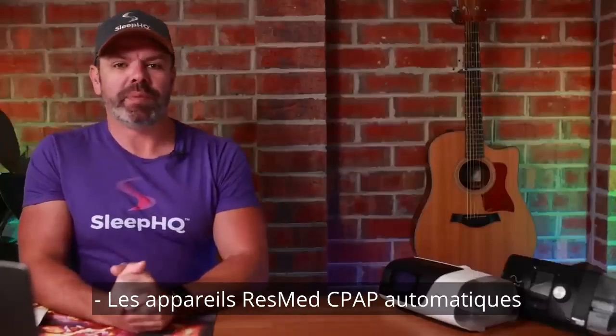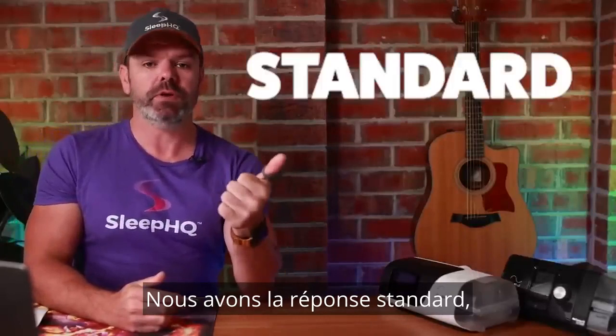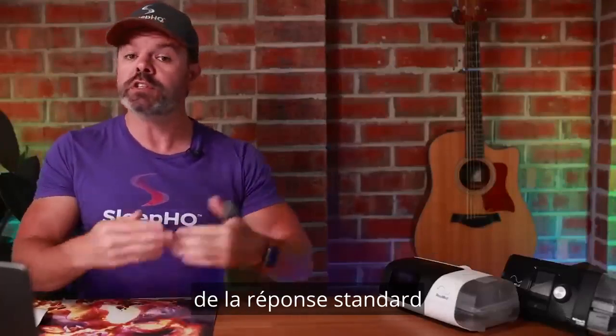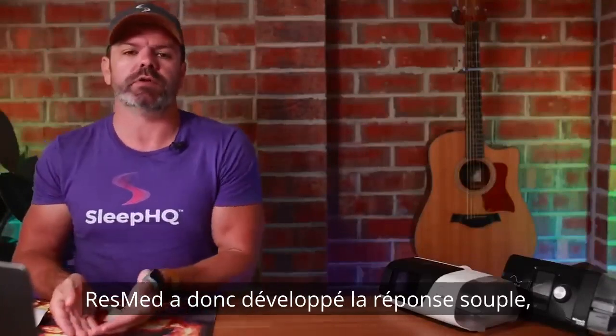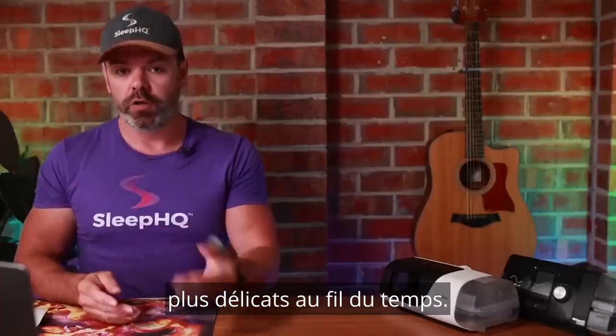ResMed automatic CPAP machines have two response modes. We have the standard response and the soft response. Now, the fast, frequent pressure changes of the standard response can sometimes disturb a patient's sleep. So ResMed developed the soft response, which provides gentler pressure changes over time.